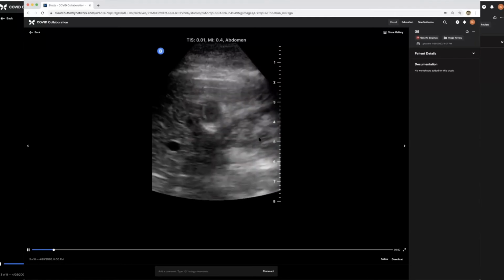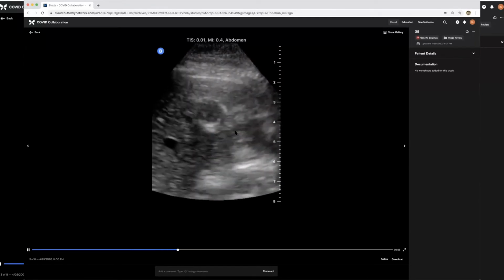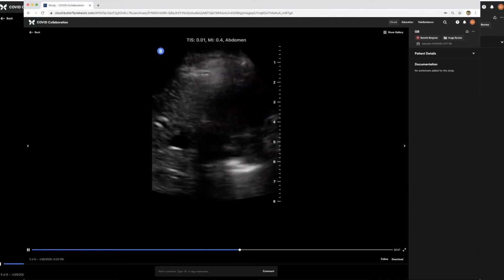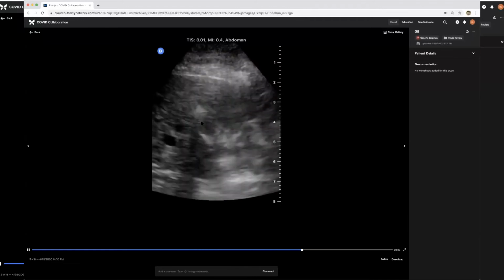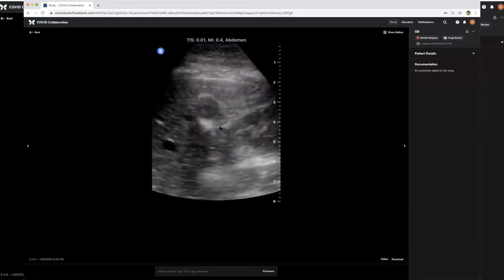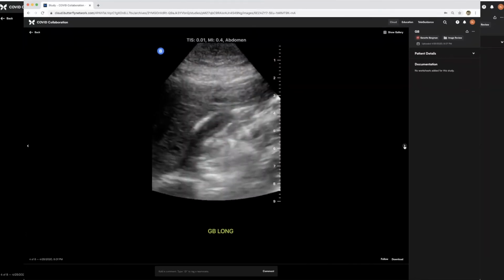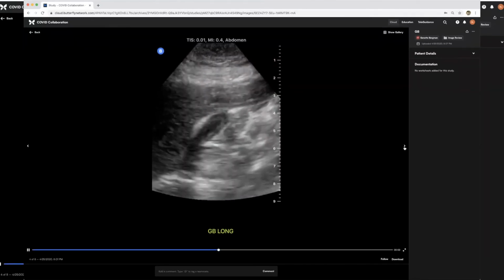And so this would be an example of the gallbladder in its short axis, which makes it super hard to find. It's this little circle here. And I think it's really cute. So I like these images. I just think they're a little adorable. But let's see if they go on to looking for the portal triad.